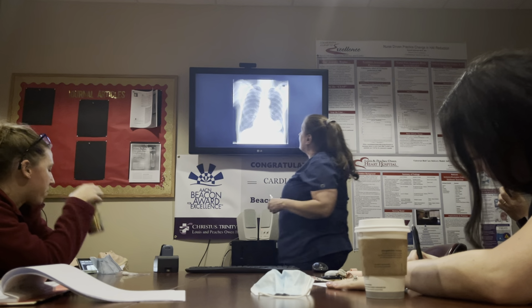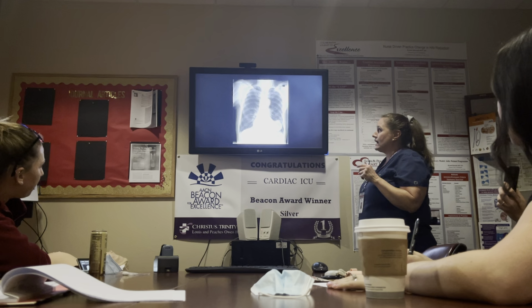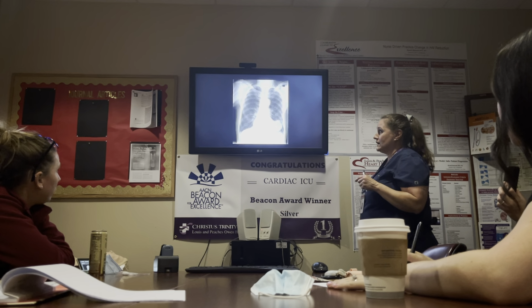Okay, what's this? It's a poor picture, I get it. This is actually a picture of one of my patients that I previously have taken care of.